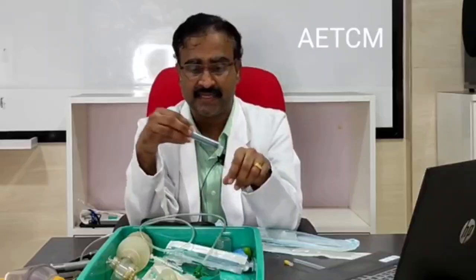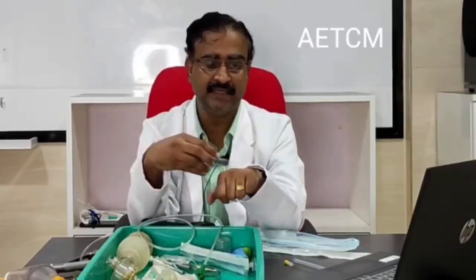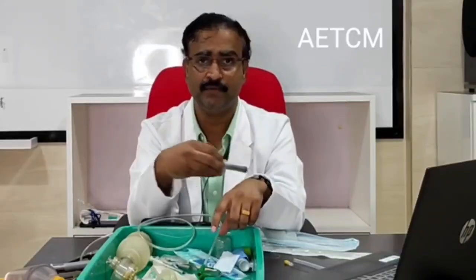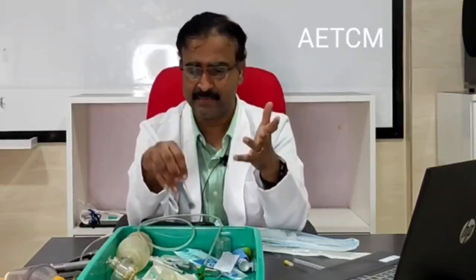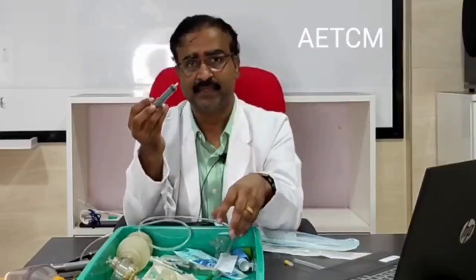Now for a diagnostic use, yes, you can actually draw blood. Once you have attached this to a needle, the needle is inserted inside a vein, and then we can do a phlebotomy. You can draw in blood and that is sent for sampling. Toxicology samples or all sorts of samples, we are all totally aware. The similar thing we also do for taking the gastric analysis sample.